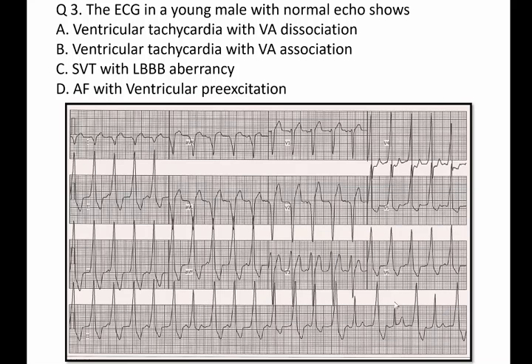So in between the wider QRS complexes, you find there are multiple other QRS complexes which look like a normal QRS, and this is probably what we call a capture beat, because a P wave which comes at a time when the AV node is non-refractory conducts through the AV node and His-Purkinje system and activates the ventricles, resulting in ventricular activation occurring through the normal AV node His-Purkinje system, resulting in a narrow QRS. Whereas the other times, where the QRS morphology is in between that of a VT QRS and the normal QRS, this is occurring as a fusion activation, where the ventricular activation is a fusion between the ventricular tachycardia focus as well as the normal ventricular activation through the His-Purkinje system.